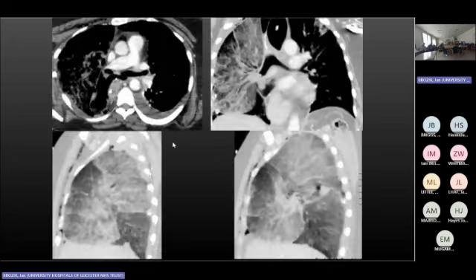There's something going on. Like a pulmonary contusion. Not entirely, but this is the contrast. This is the sagittal view, another sagittal view. But one fissure, another fissure, another fissure. There's something going on.